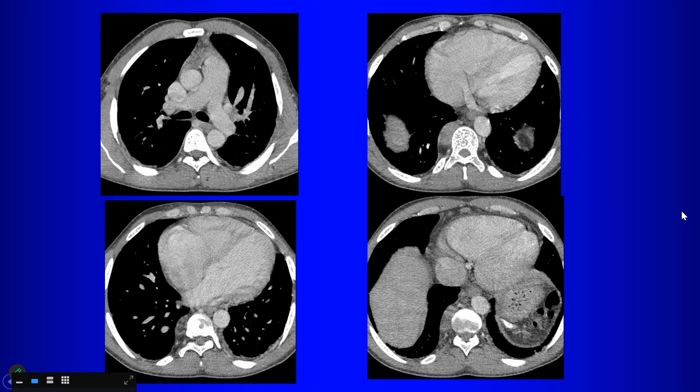And what can you say about the paraspinal mass? Well, do you see the mass here? So what are characteristics of it that are associated with extramedullary hematopoiesis? So that's some fatty component. Yeah, it has fatty components down here, right? So you see that there are fatty components within it. And that, of course, is associated with extramedullary hematopoiesis, right?